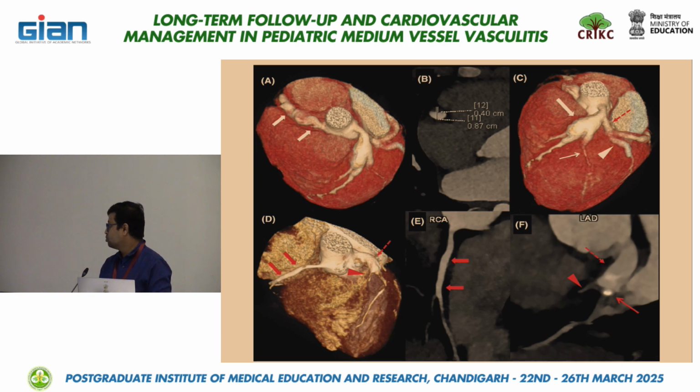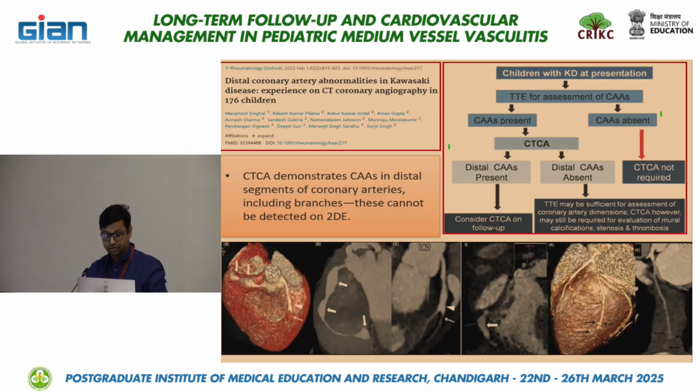This is the mid portion, which is fusiformly dilated, and here we can see this white thing, there's a calcification in the left anterior descending artery.